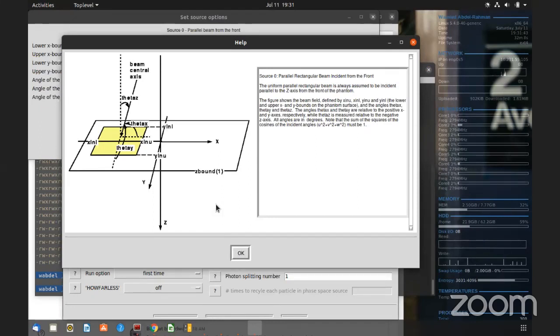Dr. Omid, this is the default coordinates in the EGS, right? Yes, default with those X, Y, Z. Okay. Can we change these coordinates or you cannot? No. Okay. What you need to do is you need to play with the beam direction. That's what you can do.